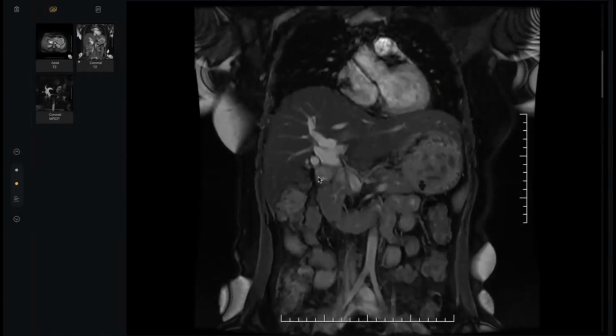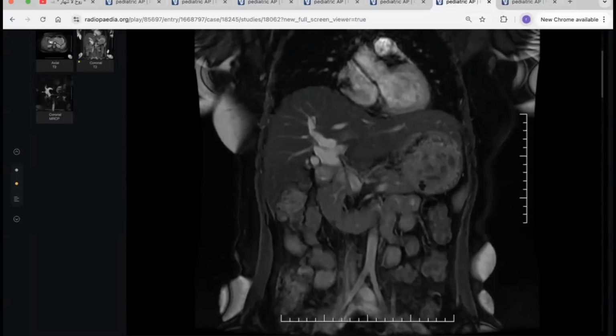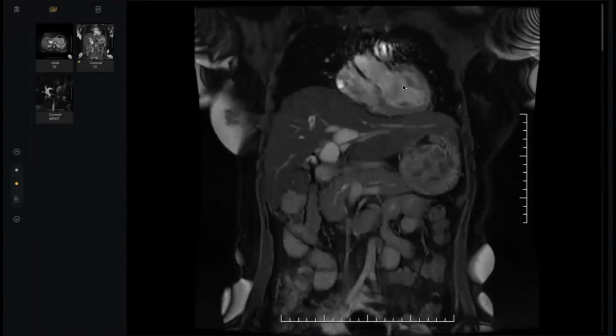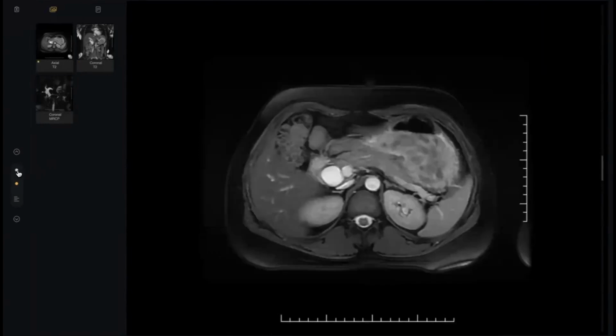Thank you, doctor, so much. I think we covered a lot. Sorry, I need to ask a question regarding this case. I was suspecting some abnormality along the greater curvature of the stomach. It was projectional, I thought, on the CT when I was looking at the sections.